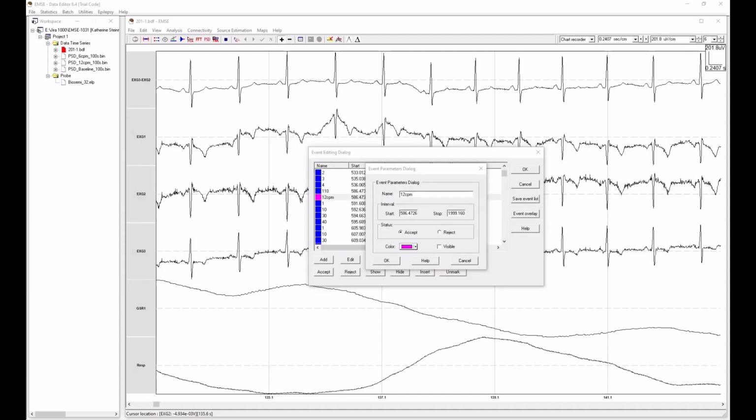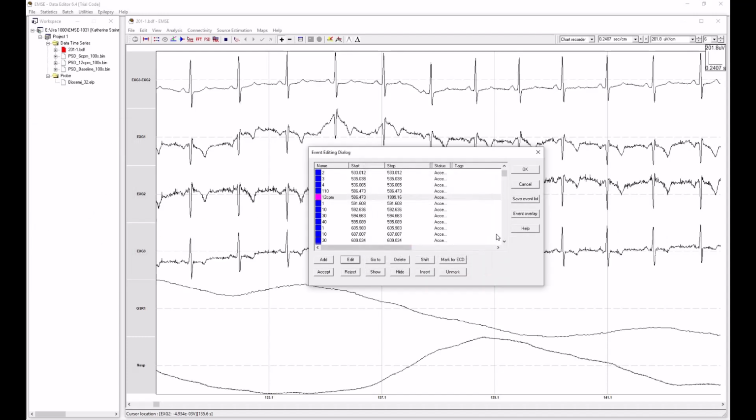So that's where I got those numbers from. The 110 is right there, so that's where I got that number. And the 111 evidently is down here a ways. There's the 111. That's where I got the 1999 number from.